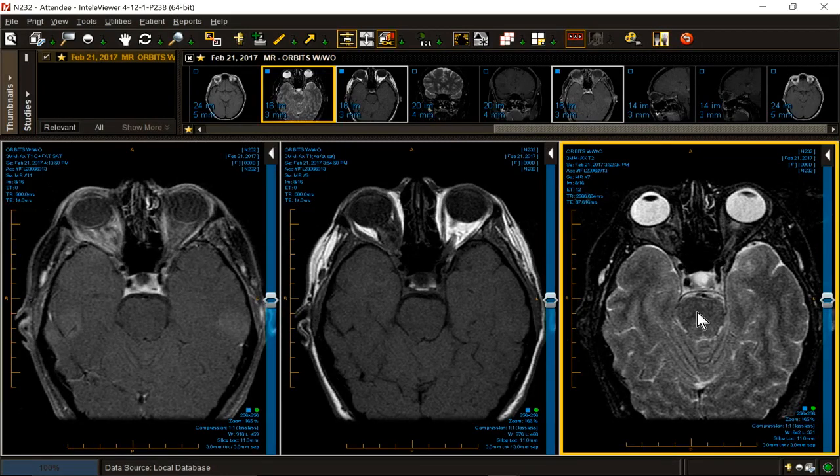So, another optic nerve intraconal problem. Same decision tree we have to make with our other optic nerve glioma, we must make again. Is this lesion coming from the optic nerve or the covering around it? And we must make this decision based on imaging, and these 3 images, axial T2, axial T1, and axial T1C tell the story, although in my opinion, the central one, the axial T1 non-contrast, and the T2 are most informative.